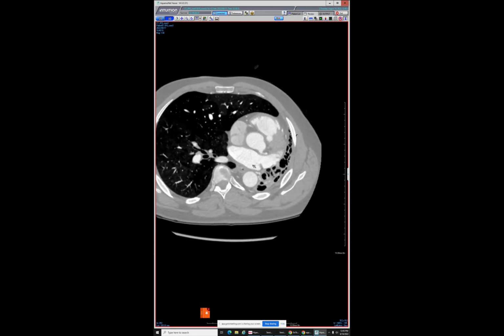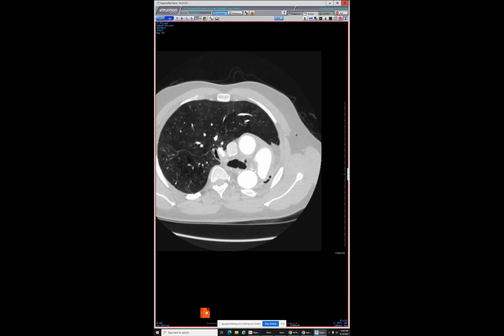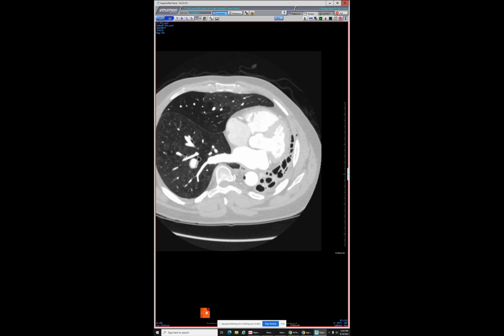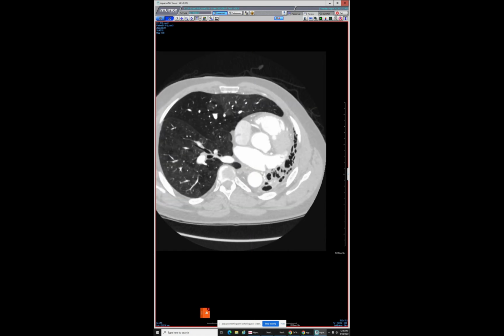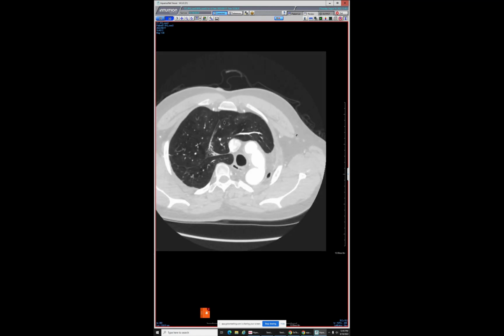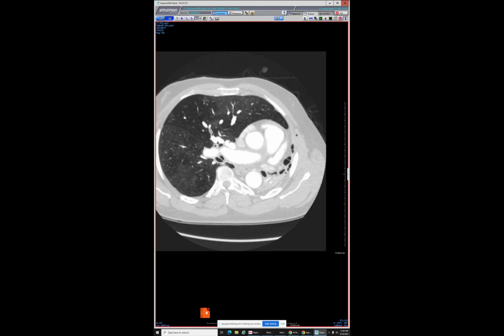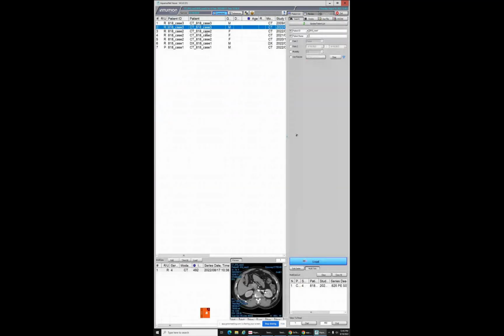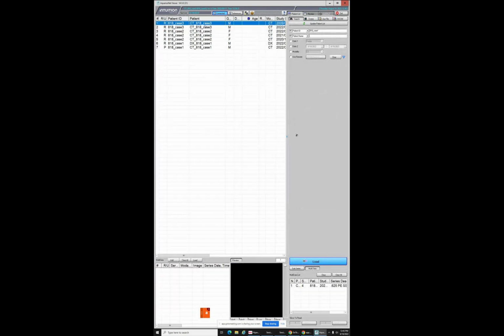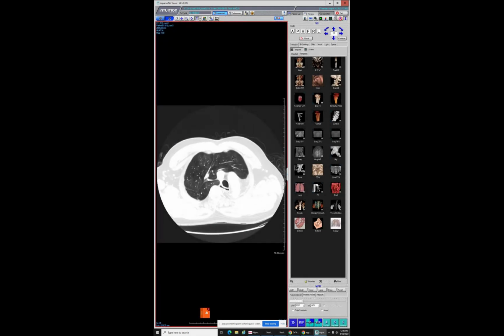And I haven't seen many cases of Behçet's, but I wouldn't think this looks like Behçet's to me. No. And then the lung attenuation, it's so odd too. Is that due to some component of the vasculitis, even though the lung attenuation finding has been there before he really developed the vasculitis? Anyways, a confusing case, probably a lot of things going on here.